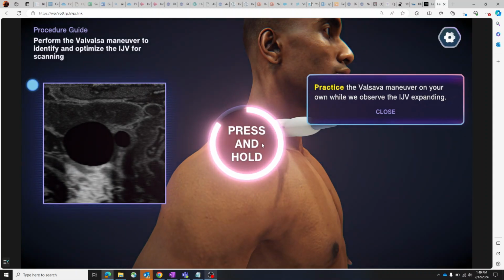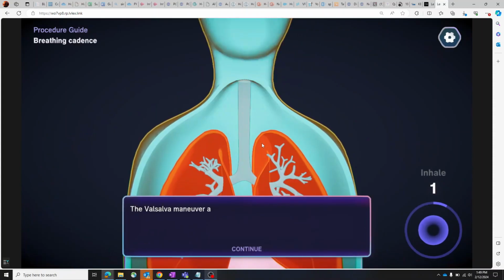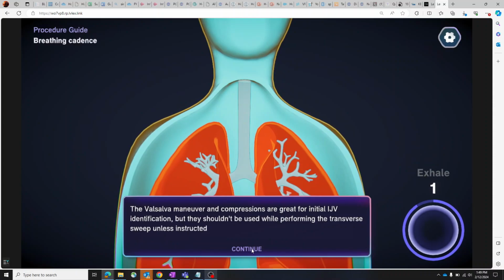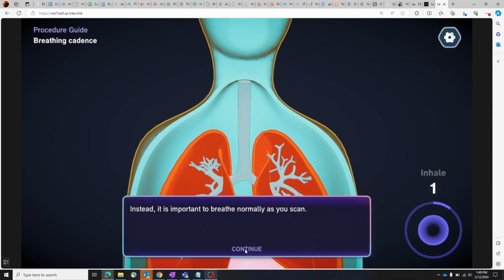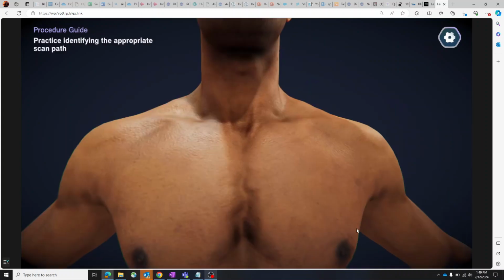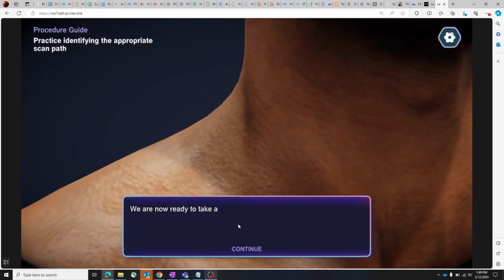So now we're getting into the image quality assessment. This is more of a quiz or like a sorting game where you're going to be shown these images, and then as you see Theo's labeling, first choosing the correct image, the one that is the highest quality, and then dragging labels to indicate why the other two images were incorrect.